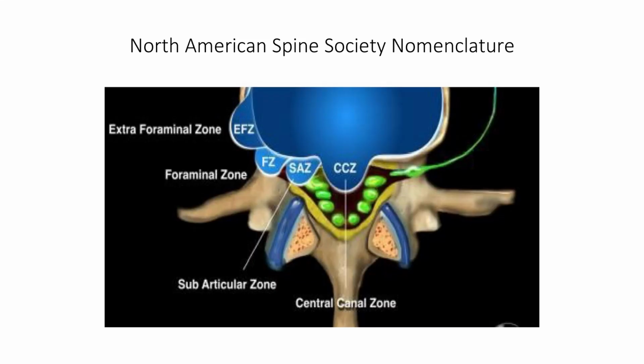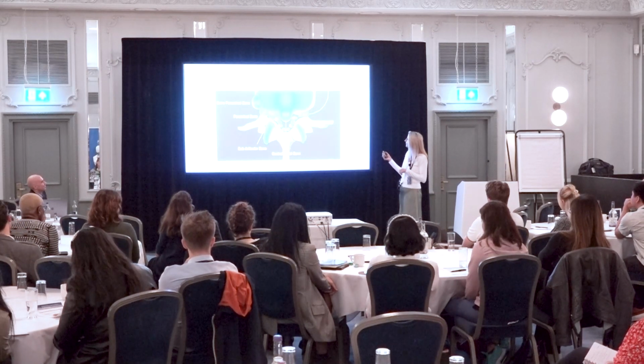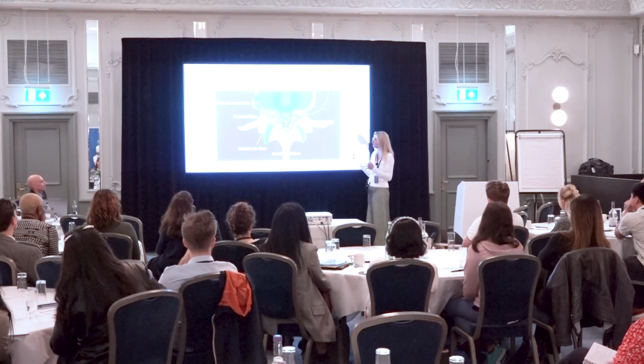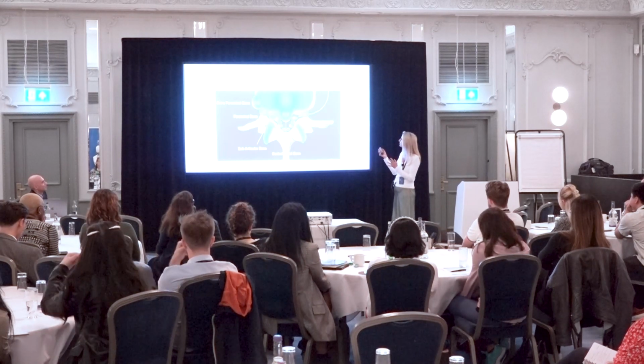So this is the North American nomenclature. When I trained, we talked about midline, and we thoroughly disapproved of using central, because central should actually be, if you look at a sagittal plane, where you get a Schmorl's node. So it hurts me to say central, but I am beginning to use it. Hated the term paracentral. I called it posterolateral. And we were very strict on our nomenclature, but you see it's all changed.